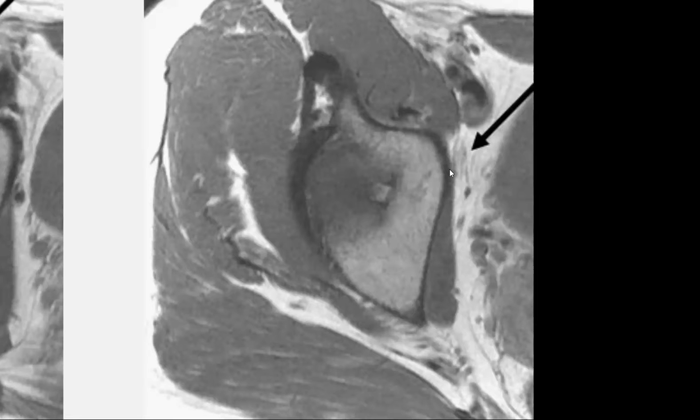So this is actually the obturator nerve. It passes posterior to the common iliac arteries. It travels along the lateral wall of the pelvis and exits the pelvis through the obturator canal, where it innervates the obturator externus, the adductors, the gracilis and pectineus, and occasionally it can be involved in pelvic pathology, or sometimes a little ganglion or cyst can impinge upon it.